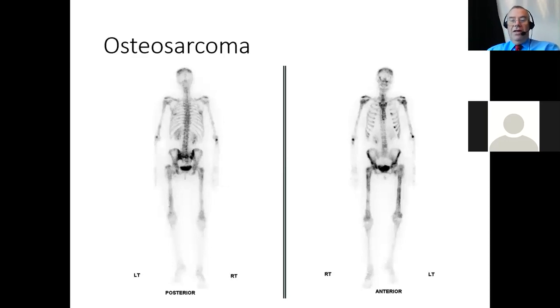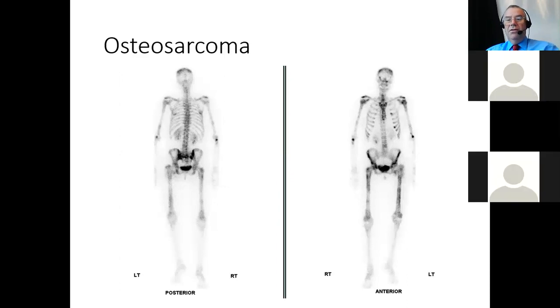Osteosarcoma, however, is completely different in the fact that it is very... That's not a good image of fibrous dysplasia. Yeah, I know. Sorry about that. But this one's a good image. You can have a look at it better when you look at it again. Yeah, I do agree. But as I was saying, the problem with a lot of fibrous dysplasia, I was giving you a realistic image. It's not often very subtle.